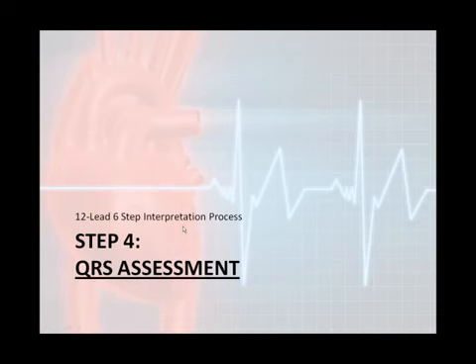Step 4 is actually the QRS assessment. Now we're not going to get heavily into the QRS assessment because the QRS assessment and the rest of these steps are actually specific components in this course. So for step 4, I'm just going to briefly cover the rest of these and then we'll practice a little bit using the first 3 steps: the general impression, calibration, and the rhythm interpretation.